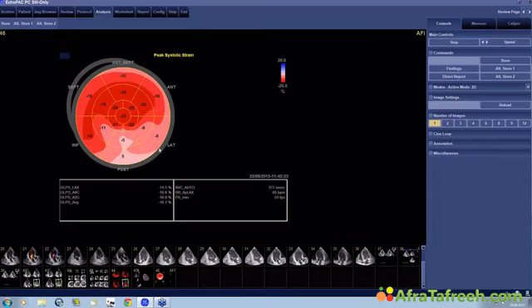Many of you have already commented on what you think the culprit lesion or culprit vessel is, and I will now go back to the coronary angiogram and show you this.